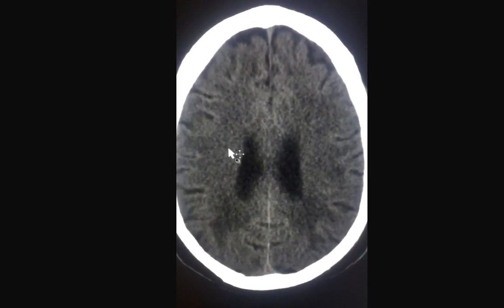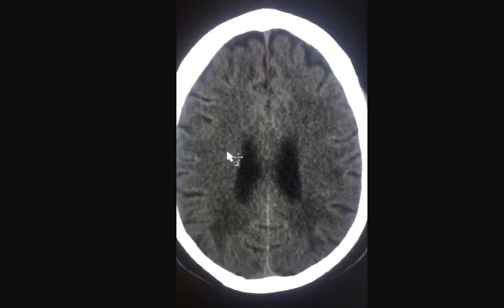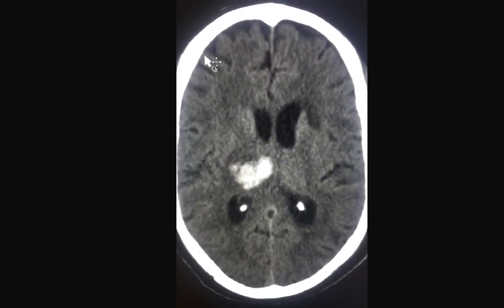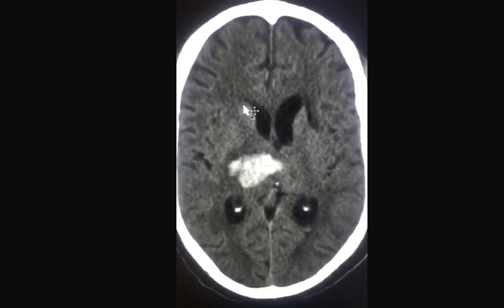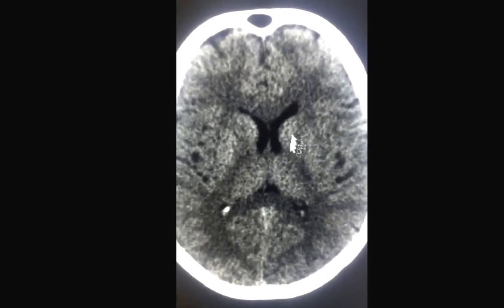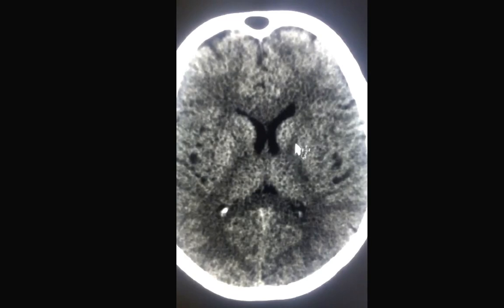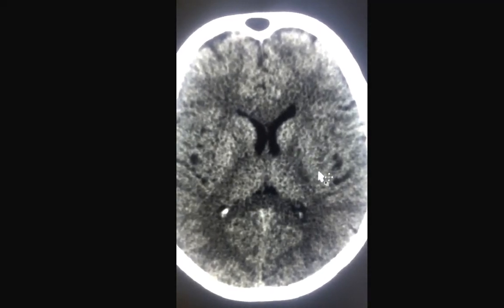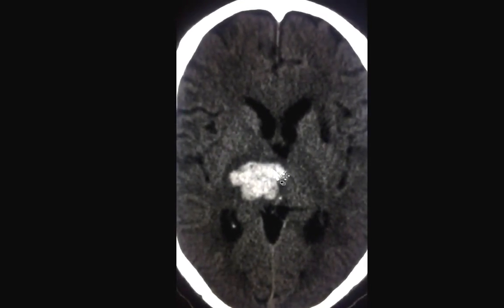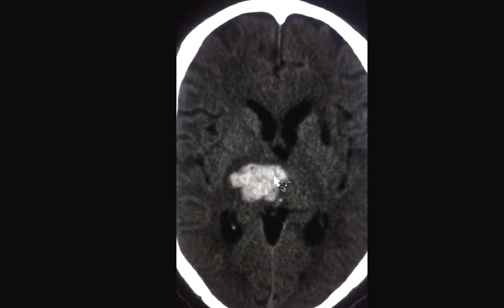So we learned a few things from this case, a few points that are directed to juniors and others for seniors. Juniors, remember that on a CT scan, the gray matter, whether superficial, which we call cortex, or deep, which we call the basal ganglia, is relatively dense. Also remember the internal anatomy of the caudate nucleus, lentiform nucleus, thalamus, the internal capsule, and then the external capsule. Additionally, things that could appear bright on a CT scan include contrast, calcium, or hemorrhage.